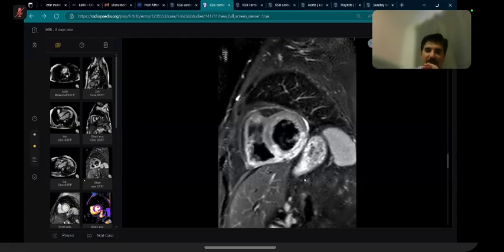Okay, so sometimes the images are taken like this. If the part of the myocardium is on the diaphragm, this is the inferior wall. Sometimes these are called anterior and inferior junctional points, and you can draw some lines from these, and from there you can also differentiate between inferior and lateral wall. But to simplify things for you, if it is sitting on the diaphragm, it is the inferior wall.